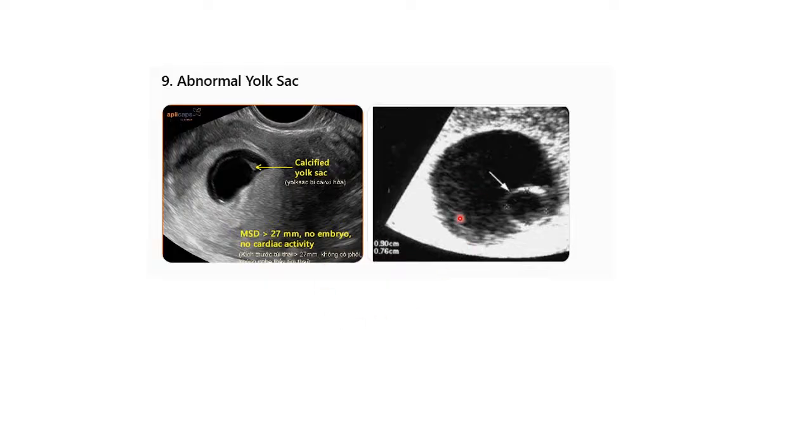Do you guys do that? Do you really check the yolk sac and analyze it for any sign of pregnancy failure? Probably 19% do, probably 15% do, probably 10%, probably 5, probably even 1% do. Do not leave out these markers. These are the silent markers. That's why you say, I did a scan today, then someone comes after a week, bleeding, already miscarrying.